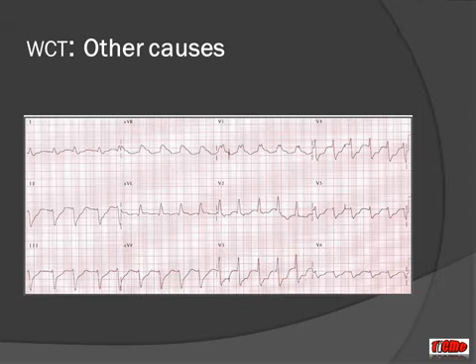Alright, now let's have a look at this next broad complex rhythm. As a standalone rhythm, it's going to be contextual to make the diagnosis. So if I told you this is a 27-year-old person who's taken a propranolol overdose, it should help you to work out what's going on. Now, basically, propranolol doesn't really work like a beta blocker in overdose. It works like a sodium channel blocker.